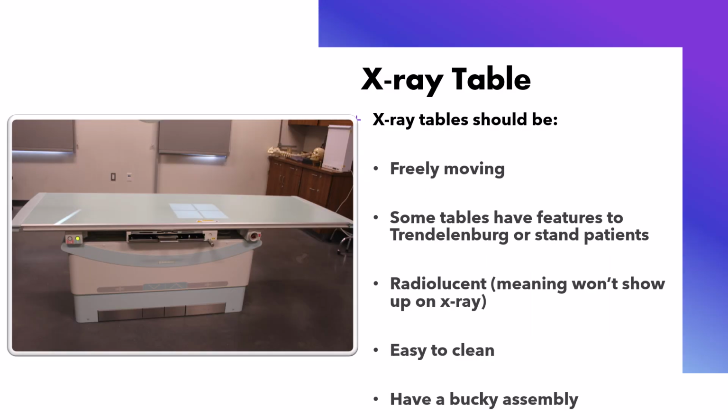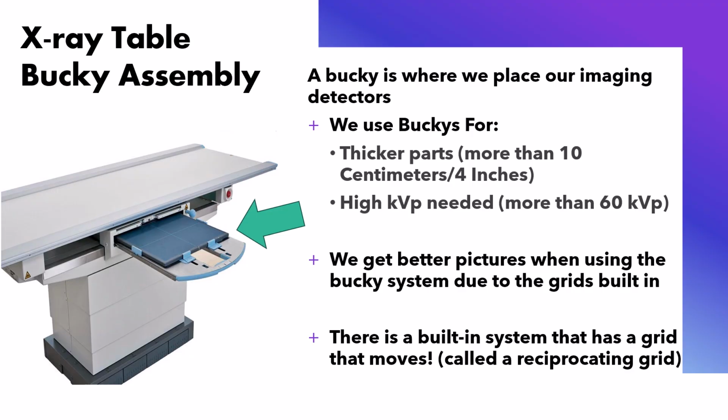If we look at the X-ray table, again, it should be freely moving. Most tables now allow you to lower and raise the height, that was not always true. They need to be something that is easy to clean, that you can clean thoroughly, and they're going to have a Bucky assembly, and you can see here. Again, we will look at a little bit more of these pieces.